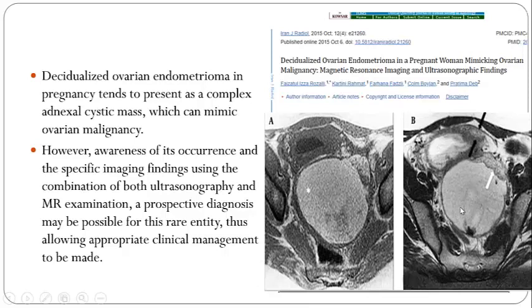It shows bright signal in T1 and T2 with the presence of endometrioma, and this is the decidualized part of the endometrioma, which is a rare finding seen. So in this case, it was proved to be decidualized endometrioma.